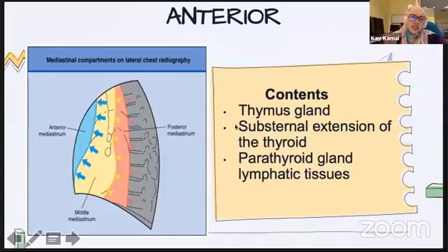So usually in the anterior mediastinum, we have the thymus, the thyroid, the glands, and if we see an anterior mediastinal mass, we give 4 general differentials, which is the 4 Ts: thyroid, thymoma, terrible lymphoma, and the, okay, I forgot the fourth.